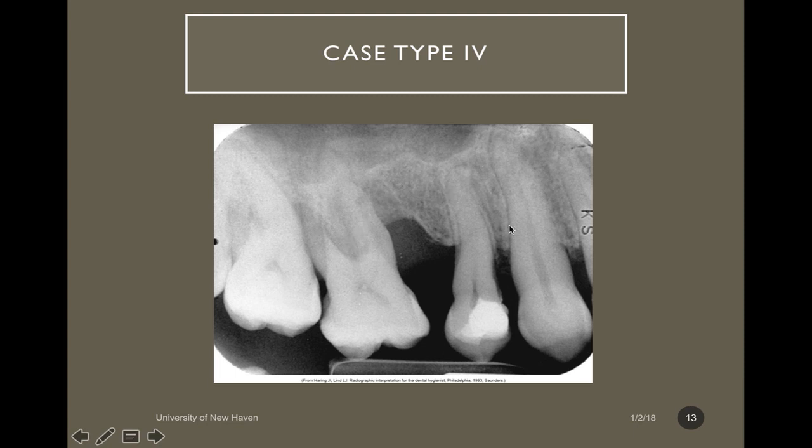I look and see that maybe I'm missing a tooth, so maybe I'll count backwards. I can definitely tell that this is tooth number 6. This is definitely our canine, and I can tell from the appearance of the crown and how long that root is. So maybe I'm missing a premolar in this area. I can also tell my molar here is super erupted, so there's definitely something going on. I'd like to see what the mandible looks like. I'd like to see the patient history. We definitely want to see what's causing the patient to have such severe loss of bone here.